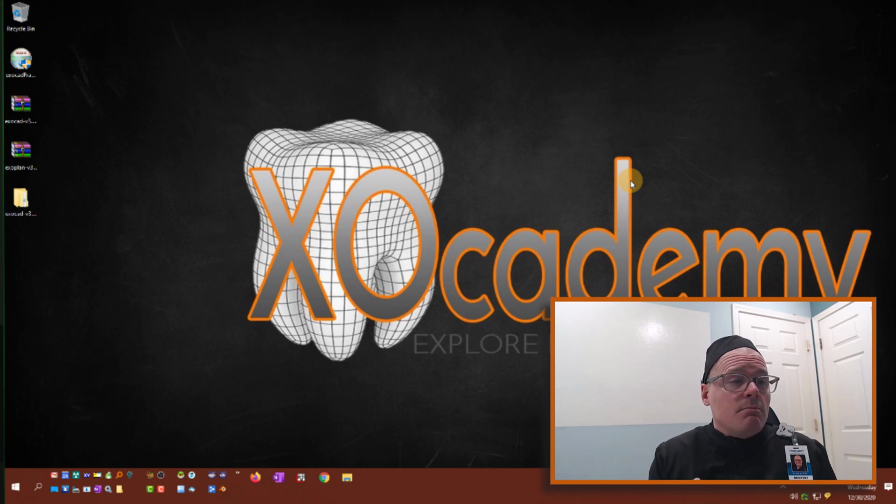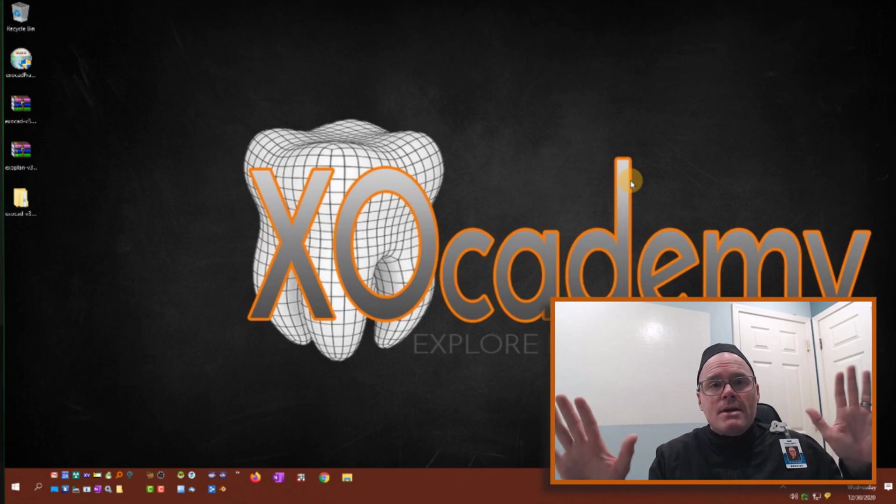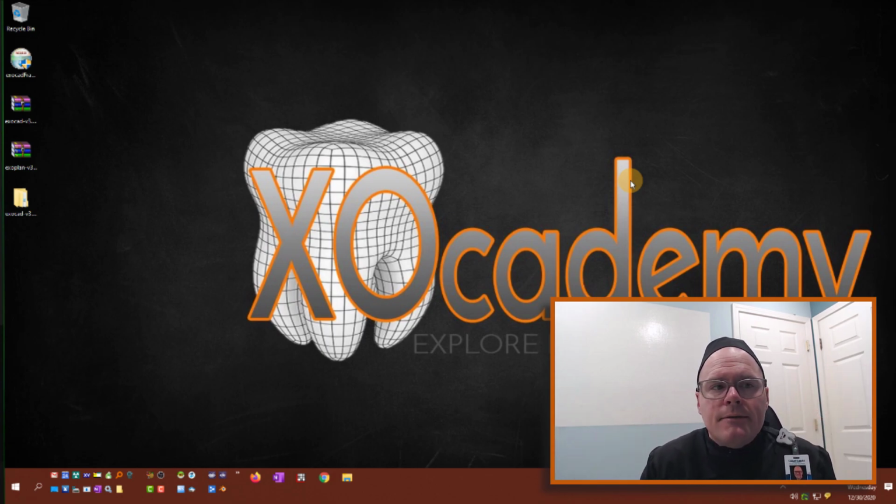So those are the kind of considerations that you've got to make when you install this and start using it, because you don't want to get too far down and then have two separate databases for all of your designs. Keep them all together. And I would suggest you put them on a network folder that has the same drive associated with it, like your X drive or your Z drive, mapped to the same spot from all of your workstations.